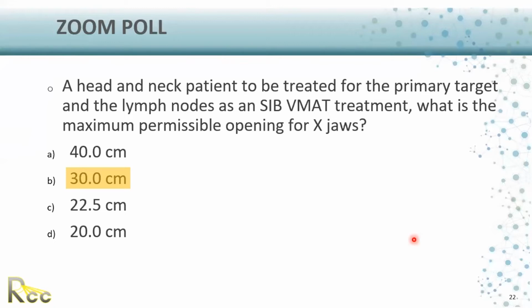We calculate the transmission through the couch, which is about 2% of your dosage. So it's just 2%. It's not a big deal, but as a medical physicist, you need to eliminate error in your calculation. It should not exceed 5%. So if you did not include this, then you have 2% out of the 5% just from the couch itself.